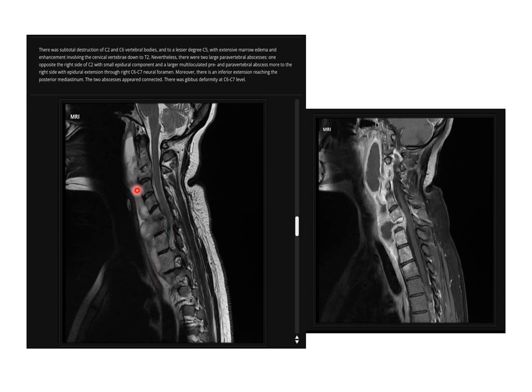The features of TB spondylitis: it's multi-level and associated with abscess. The abscess is subligamentous in the anterior, and the wall of the abscess will be a thin, enhancing wall. See here, this level is involved, and between them are spared. Why? Because it spreads in a subligamentous level, starting from here all the way to here. These are spared, then involved, then spared, then involved. So this is typical for TB, subligamentous spread of TB.